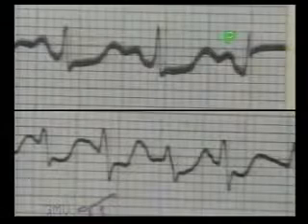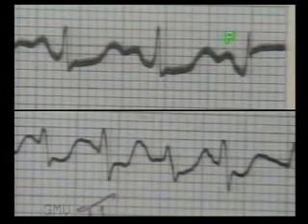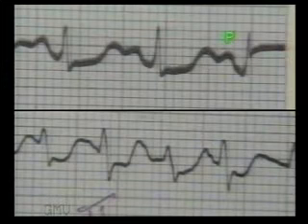In this ECG, P waves are difficult to identify in the lower lead, but you should observe all the leads carefully for P waves. Though they overlap with T waves, usually in at least one of the leads it is possible to identify P waves. Note how prominent they are in another lead in the same patient.